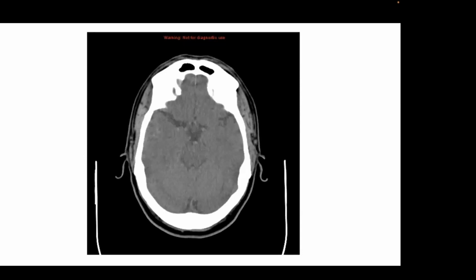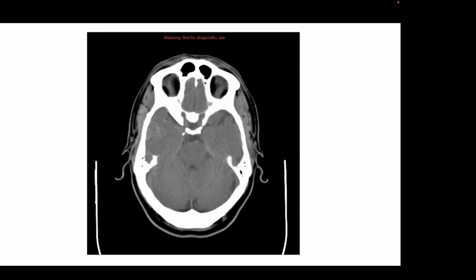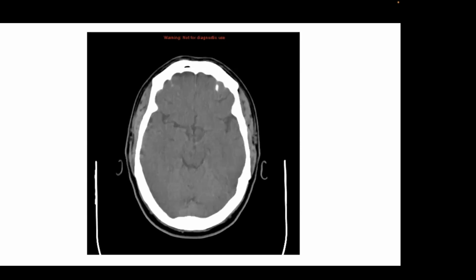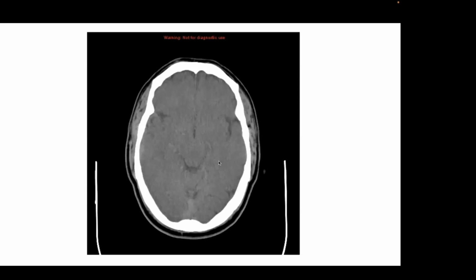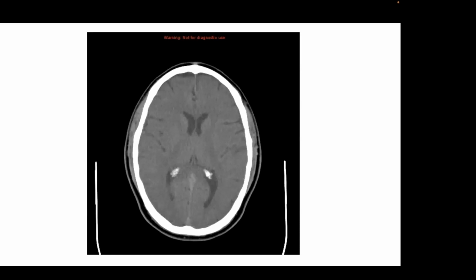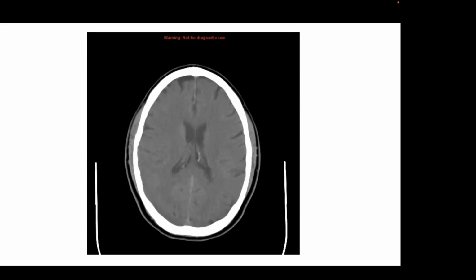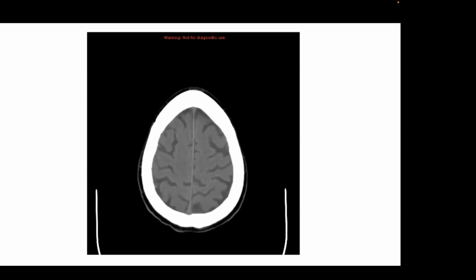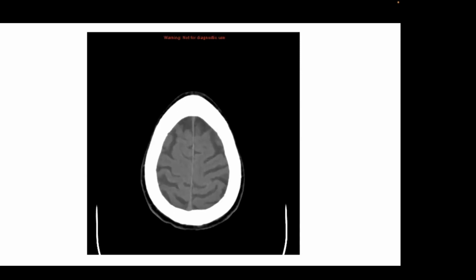Do you see this right here and here? So when you see these unexplained calcifications, or you see the vasculature is also going to be a little denser than the brain, in a case like this, who may have had a temporal lobe seizure, you really have to pursue it. So that is an example of the very subtle early findings of an arteriovenous malformation.